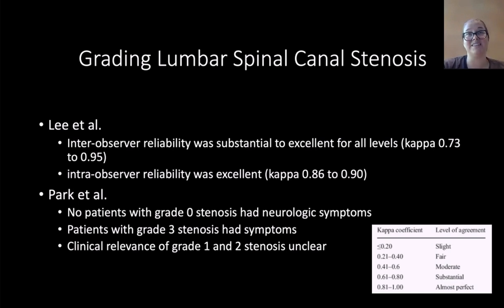But it would be nice, even among the neuroradiologists at our site, Ewan, maybe we should just say we're going to use this system, and we're just going to talk to the chief of surgery and say, this is what we want to use. Are you happy with it? And here's a summary of what the findings are. That might be a good idea. We can talk about that. Totally. There are a number of grading systems.